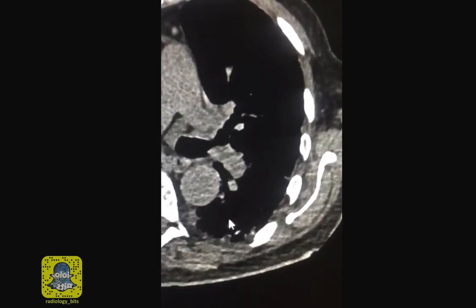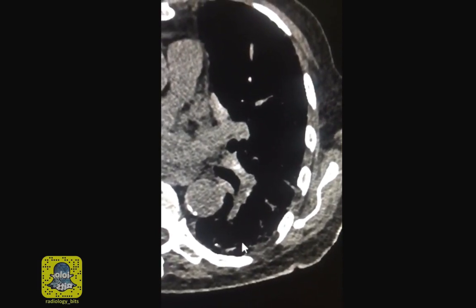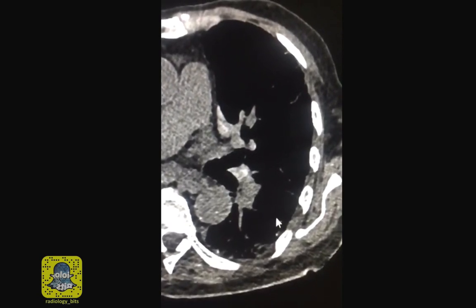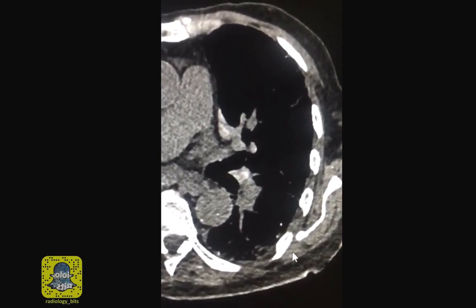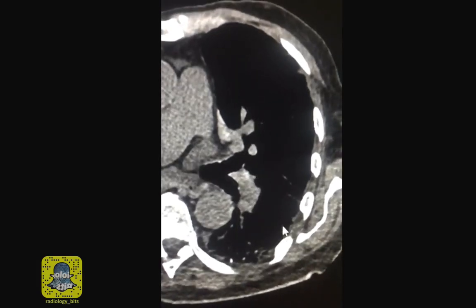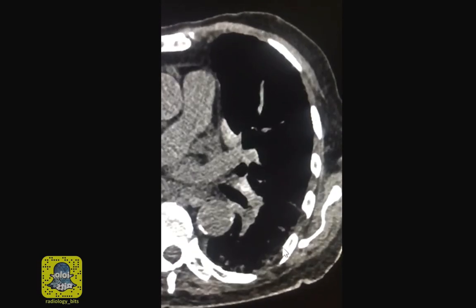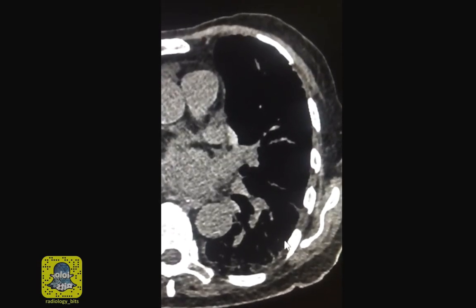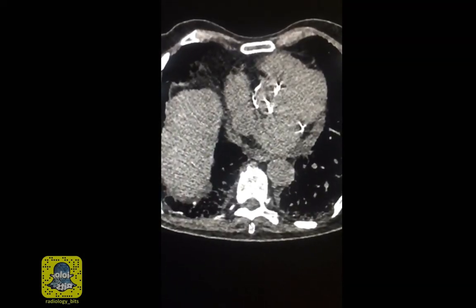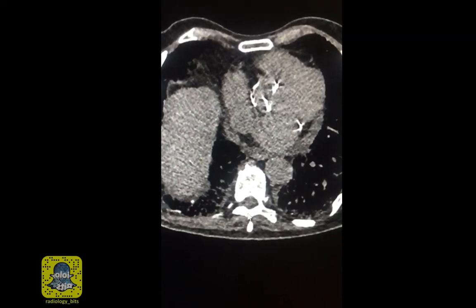Now back to the important point. In many cases, this would be reported as a calcified granuloma, and the implication of that in endemic areas may mean that this patient has old TB or latent TB. Although latent TB is common, it's not active TB. Just putting that in the report might have some implications. And here comes the potential misconcept. These calcific foci are most likely not granulomas.